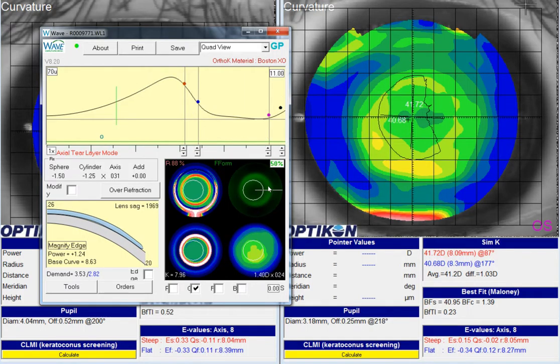And then we're going to subtract 10 microns in the horizontal. So currently we're at 743. We're going to end at 733. A little too much.